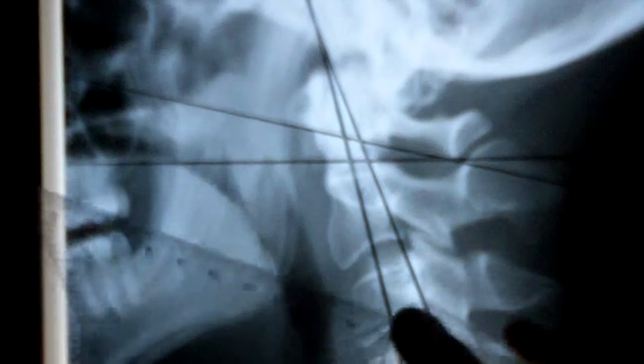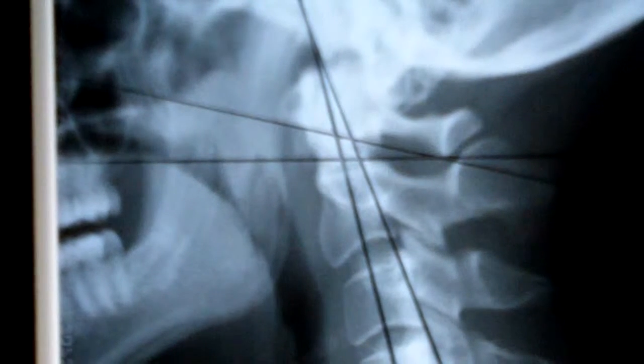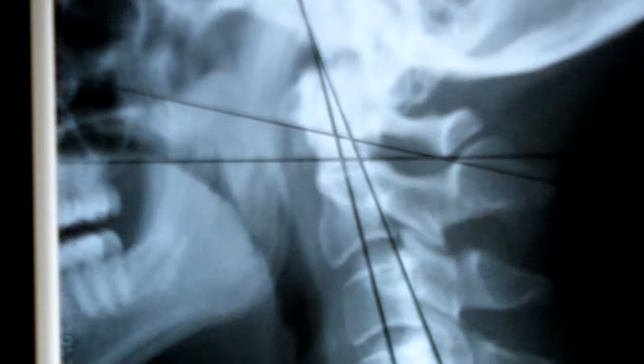We're going to find this angle too, so you want to get to the point where they converge and measure it. And this is 12 degrees. Can you measure that curve one more time? 13 degrees. Okay. So I marked this one at the very bottom, 13 degrees. Normal atlas plane line should be 29, and I just dash it and I write an APL.